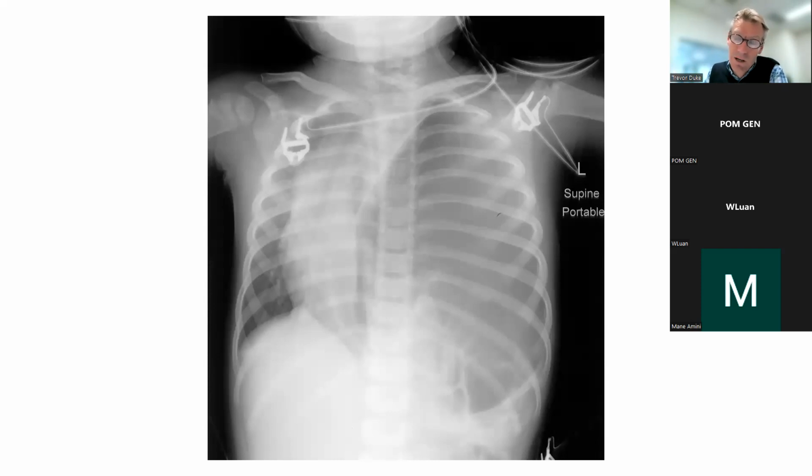You don't usually have much mobility about the large bowel. But what is close to the diaphragm that might move up into the chest? The stomach. Yeah, good. So this is the stomach in the chest. This is a child who was 2 years of age and presented again with an incidental finding, during a respiratory infection, of having the stomach in the chest, and with a small amount of small bowel. Sometimes the spleen can be in the chest, sometimes the bowel, or sometimes the stomach.